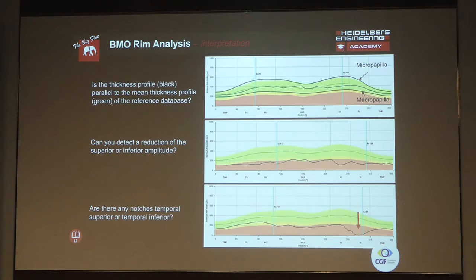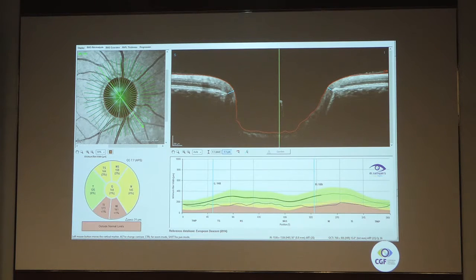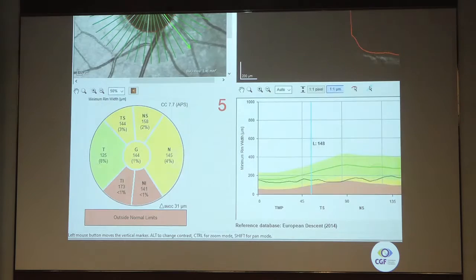So this is the same thing which I was just trying to discuss, how you can really look at the localized area of damage. And this is the same line which I was just describing.